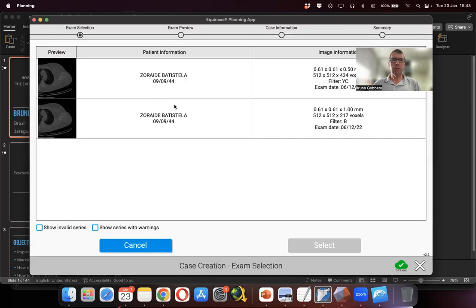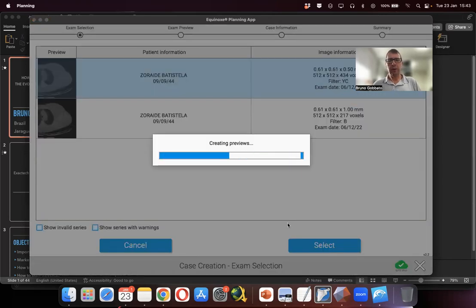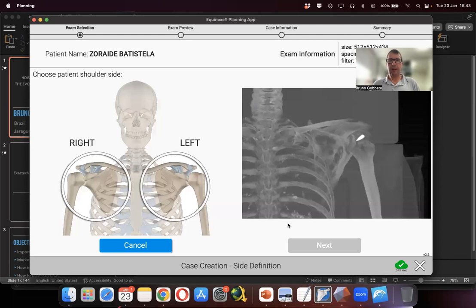So it will upload. We can select which view we want, of course the axial view, and it will generate a preview of the CT scan that we're going to check if everything is correct. So step number one is just to check if the preview and the image and the CT look okay, and we can go on further to proceed to our analysis.